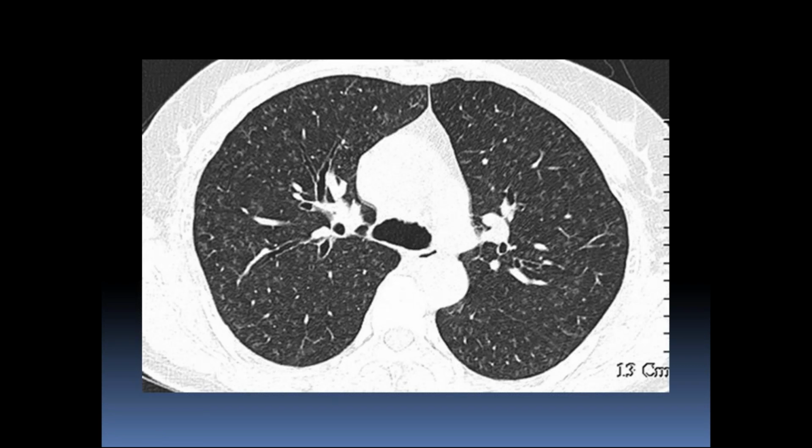So moving into another area. Now this one is a little bit difficult. This is where high-res chest really kind of gets a little bit difficult, and you get your oh my god moments, what am I going to do with this? So in this patient, what do we have? Where are we? So the pattern, you can see the tiny ground glass nodules, and you can see them pretty much in the central areas of the secondary lobular unit. Now, I don't have any kind of cartoons. There's no outlining them, no pathology outlining them. You just kind of have to trust me on that.